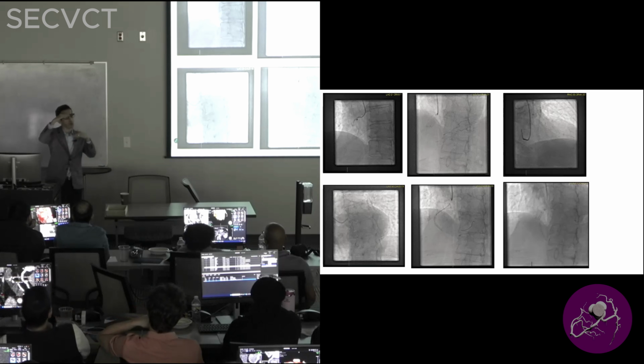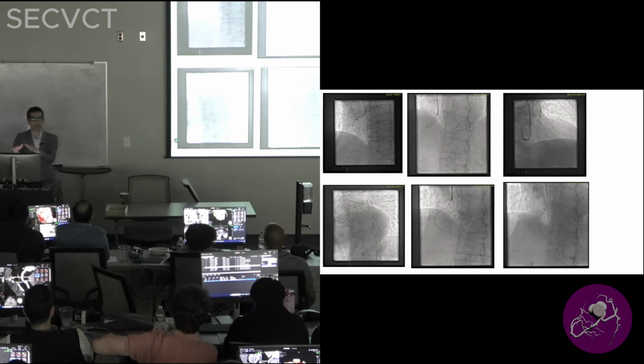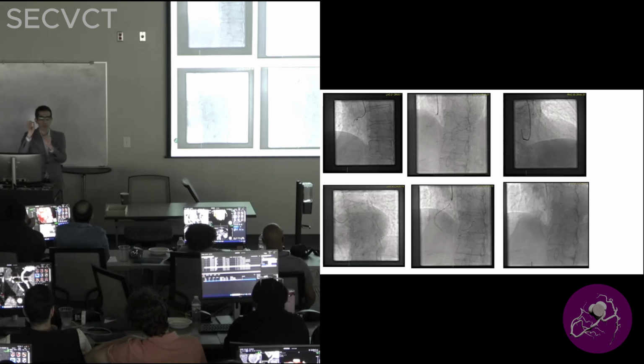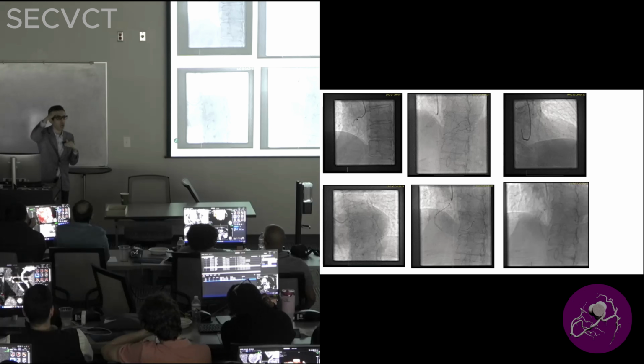The reason is if you go too high above the carina and you do prospective, the next acquisition will truncate the left main. Sometimes there might be significant motion, and the CT-FFR relies on a perfectly imaged left main. If you truncate your left main, your CT-FFR cannot be used. So don't compromise the height.